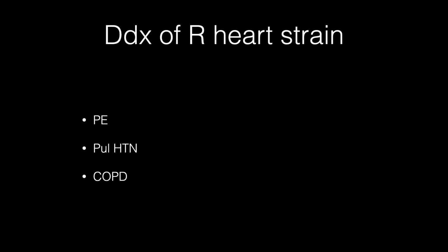We had that enlarged right heart, although the septum wasn't flattened too much. We have thickened wall, and that really brings up a differential diagnosis for us of pulmonary embolism, pulmonary hypertension, COPD, things like that. And so we know this patient's probably got some COPD. It's probably contributing to their pulmonary hypertension. And they're probably just having a decompensation from that perspective, causing their symptoms, right?